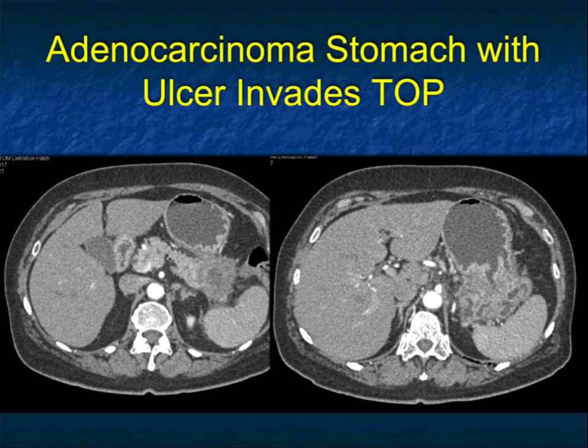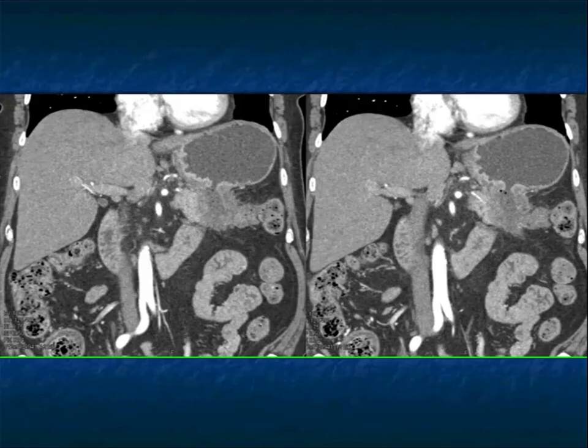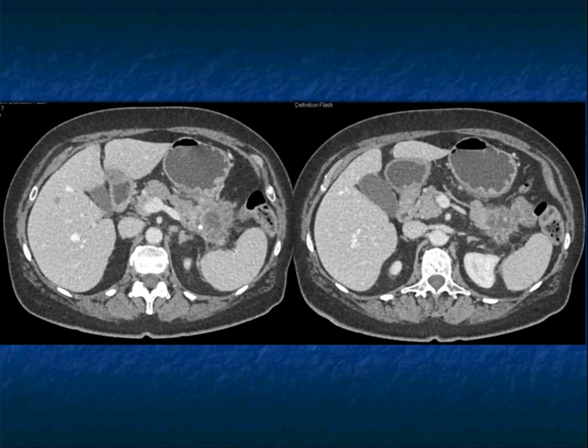At first glance, the image on your left looks something more like a pancreatic tail lesion. Then you realize it's coming off the fundus of the stomach posteriorly. Now, sometimes it's hard. Remember, pancreatic cancer can invade the stomach, but when you start looking at all the images, you recognize there's an ulceration here. There's the tumor growing out. This was an adenocarcinoma. Perhaps you might have thought about a GIST tumor as well, but just very nicely also showing you the spread to the patient's colon.